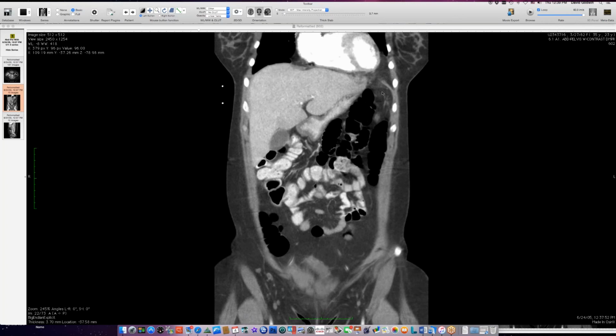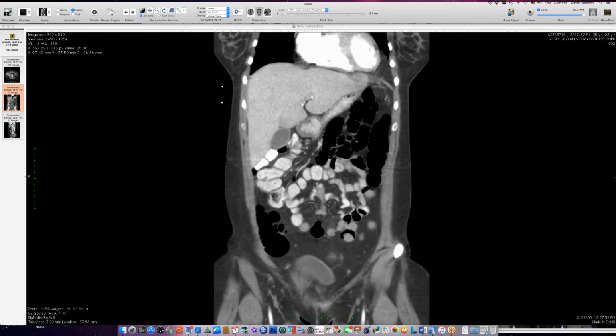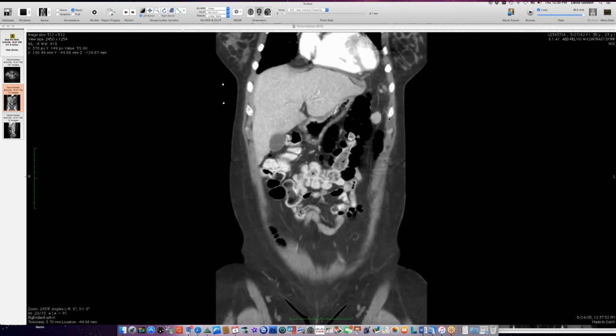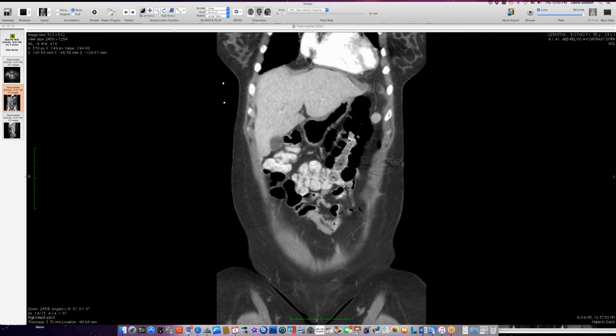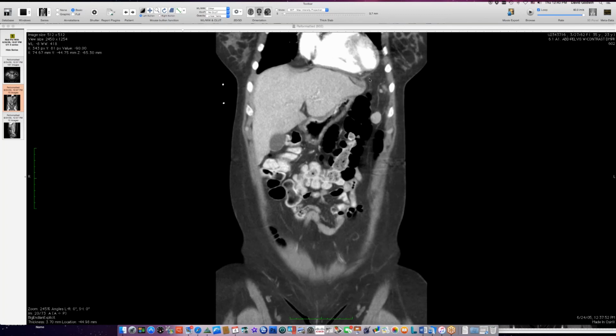So in the old days, they put the LVADs in the upper abdomen. They brought them through the diaphragm into the left ventricular apex. This was a HeartMate. And this person had splenectomy. This little nodule here is actually a splenule, that's left over spleen tissue. But you can see the continuity of vessels here across this diaphragmatic defect. So that's one post-LVAD diaphragm defect.